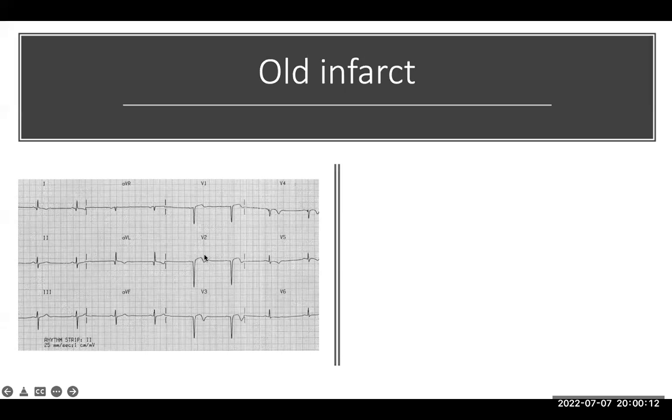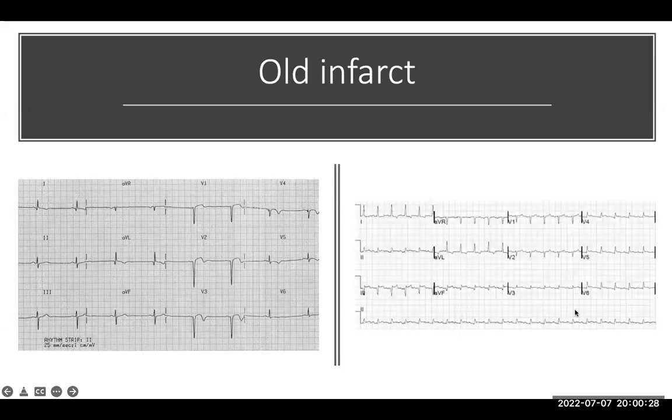And in fact, right now, even there is ST segment elevation in V2 and V3, and you can see T wave inversion. When you see this kind of thing, this is a patient who has already had MI before, but is also suffering another event. And therefore, you take the patient immediately to cath lab.